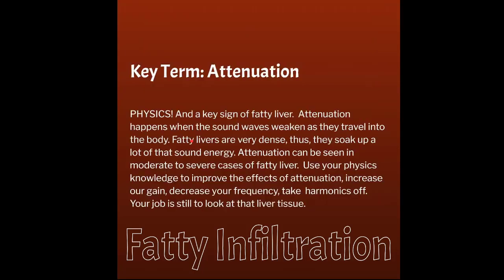So attenuation is actually one of our key terms. This is a throwback to physics, and it's a key sign of fatty liver. So remember that attenuation happens when sound has to travel through tissue that causes the sound beam to weaken.